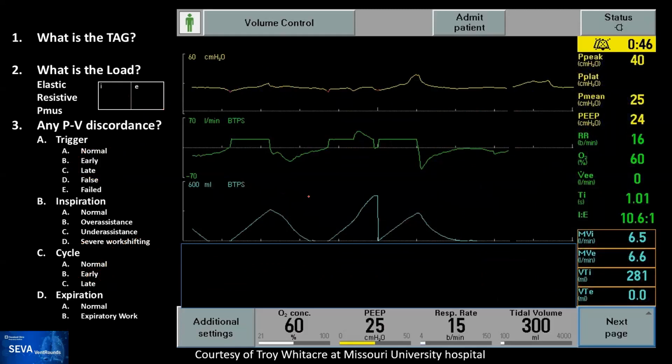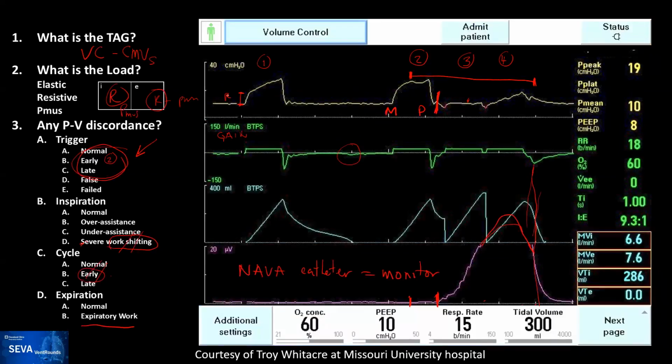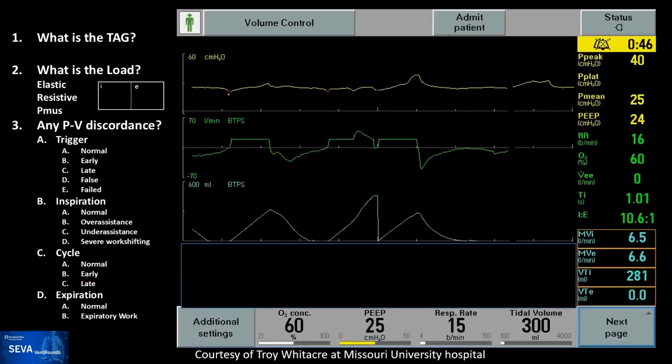So in the sake of time, I want you to compare the past with here, and you can see that the patient is in a different PEEP. So they have increased the PEEP. And that's a classic good management of a tracheomalacia and tracheobronchiomalacia. You have to use higher PEEPs to try to control that. But you can see at very high PEEPs, the pressure that this patient is getting, even though the gain is all the way to 60, it's essentially flat.